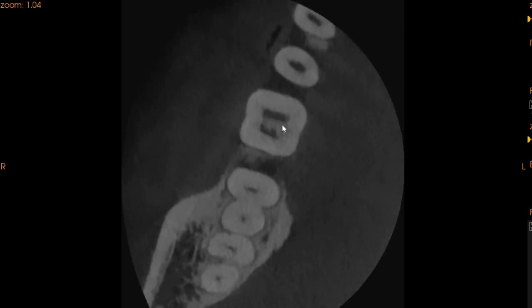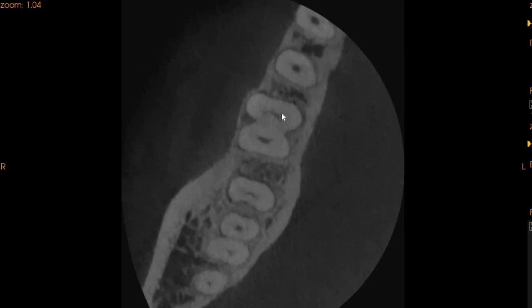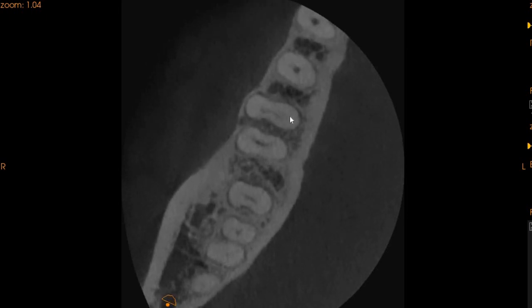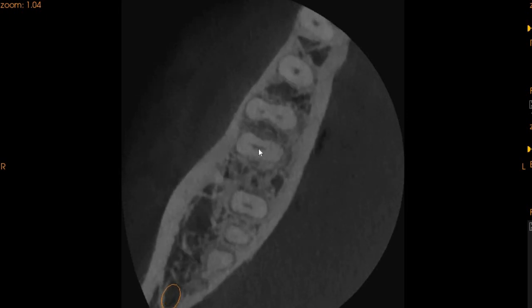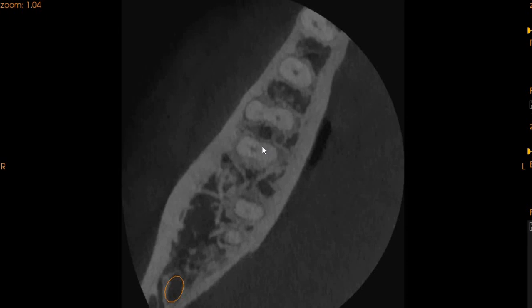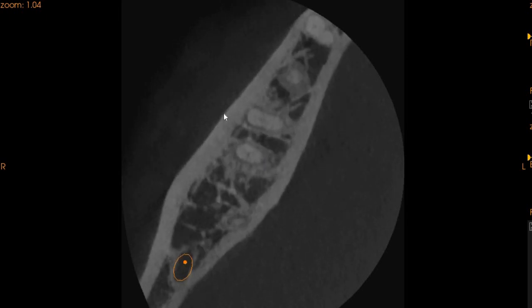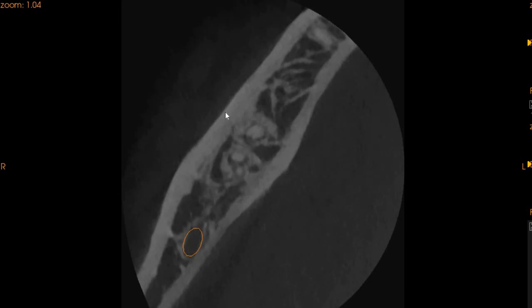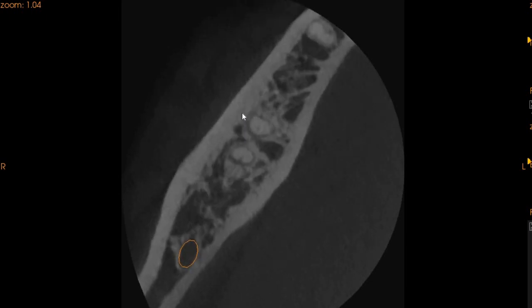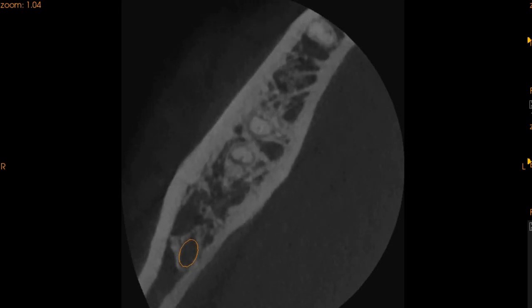As we go further below, this is the mesial root. We've got a mesial root which has two canals that we can see which separate. We've got one single wide canal in the distal, and we don't see any signs of cracks or any J-shaped radiolucencies or any periapical radiolucencies of any significance. Both the canals in the mesial join to exit as one, as you can clearly see on this segment.